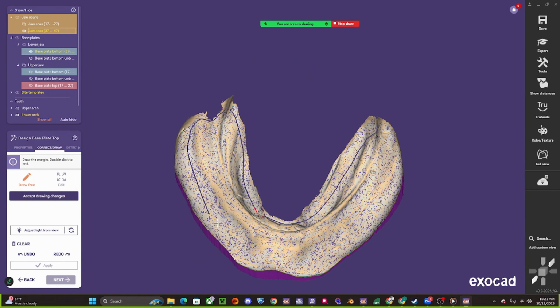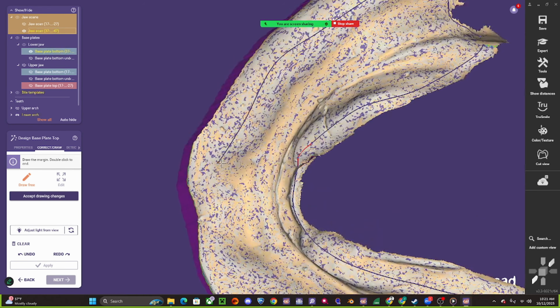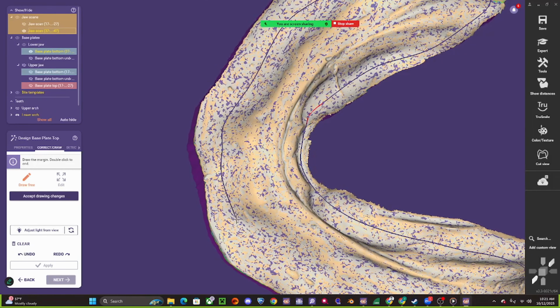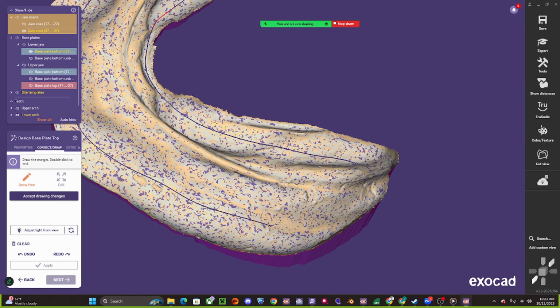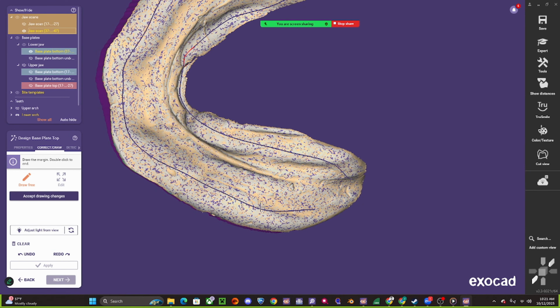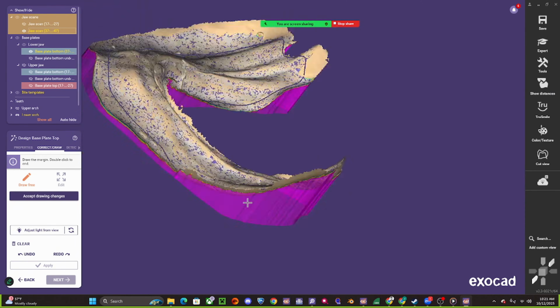And then we'll go around this vestibule here. And we can always remove from this base too. Just trim it down with our burr afterwards. We have to see how it is chairside and go from there. So I'm really looking forward to the feedback on that.